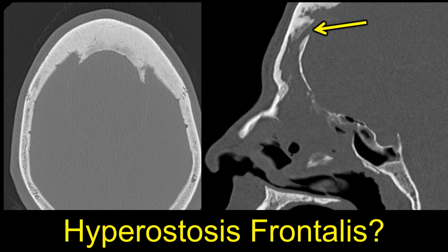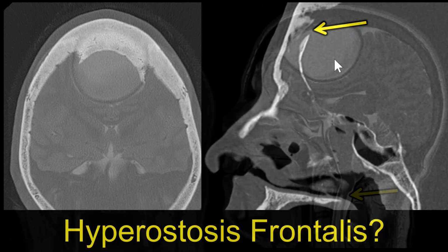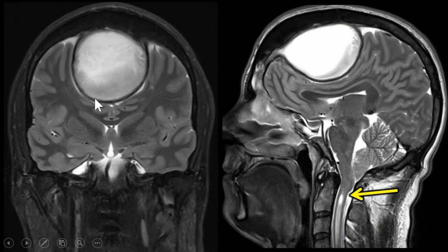So we had a CT where we're looking at the densities of stuff. It's very good for bones. But if we want to see intracranially, you see we may not see the brain as well here on the CT as we might with an MRI. So we decided to get an MRI on this patient because things that are very watery, like the brain, we see pretty well on MRI. So we did an MRI, and you see there's a very large mass at this level.